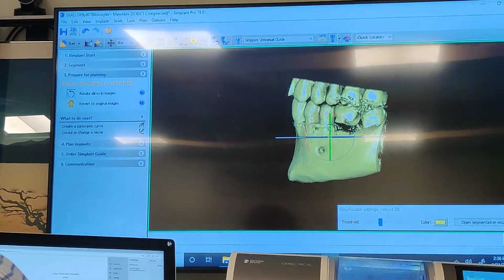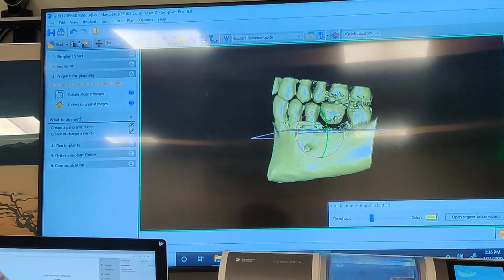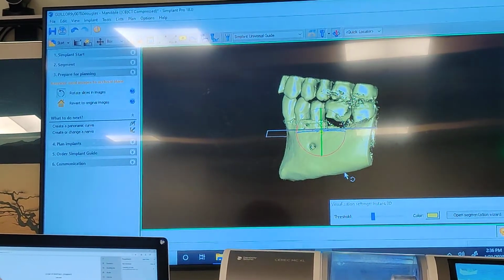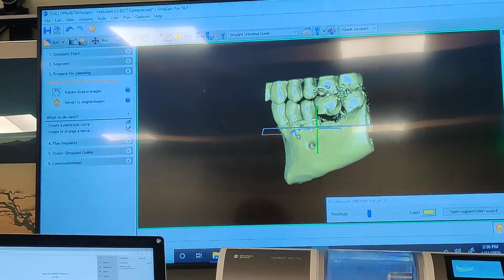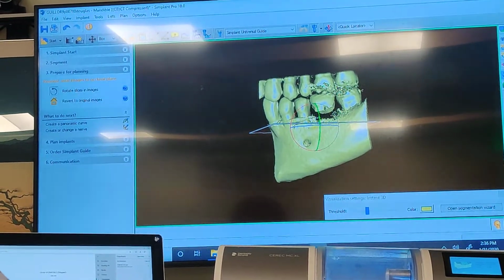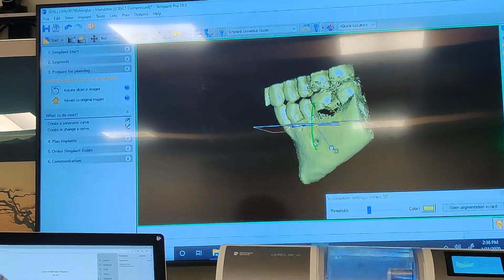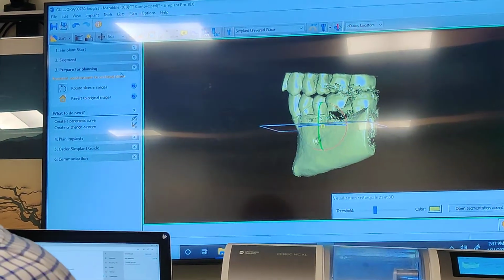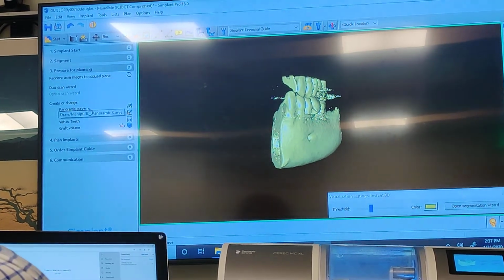So does that all make sense? So that line needs to be parallel with my tooth. How my tooth's going to be. Questions about that? Now you may say I've overcorrected it some, and maybe I did. And so then you can, well, whatever, right? What do y'all think? Yeah. Okay. Nope, no, wrong way. Yeah, that's better. Okay? Yeah, that's better. After you've done that, don't spend time, just close it. Okay, that's done.